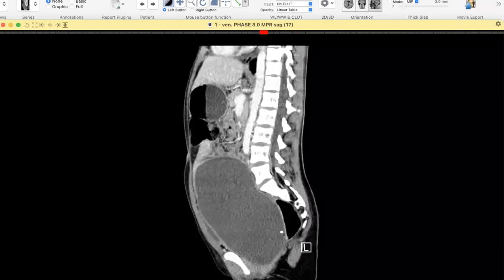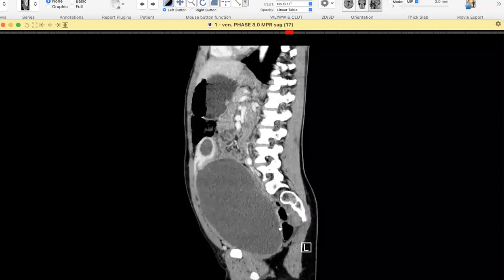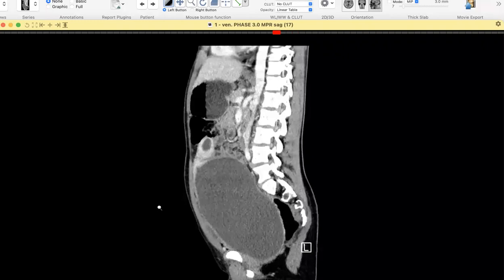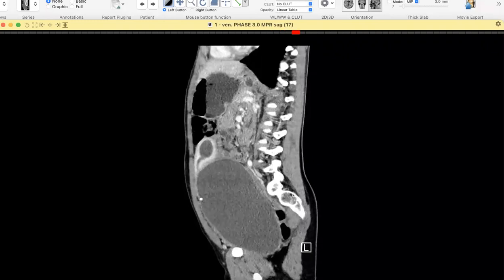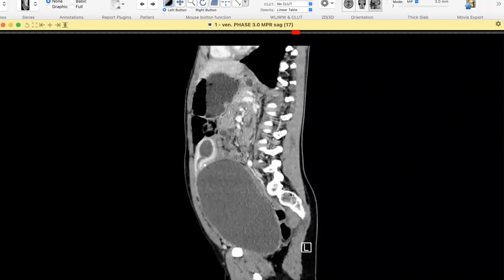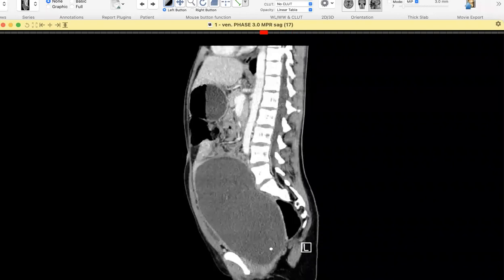So when you do CT for an imperforate hymen, this is the typical appearance. Generally, we don't do it, because the clinician will directly suspect imperforate hymen, and there's a simple clinical test to see if the hymen is perforated or not, and they will perforate it themselves without needing additional imaging. But in the cases where they do CT, this is a typical appearance. The vagina will be this distended. So this is hematometrocolpus.